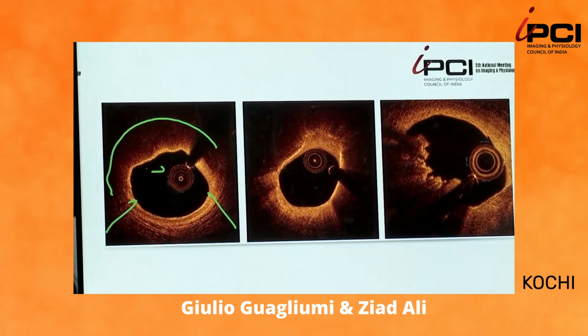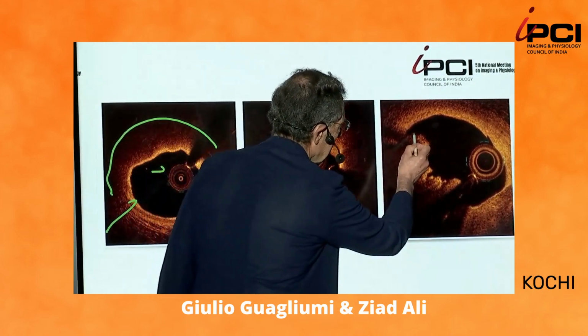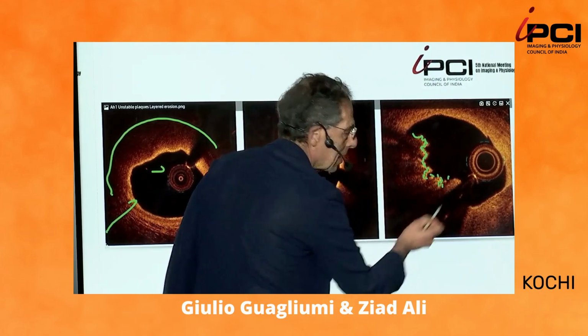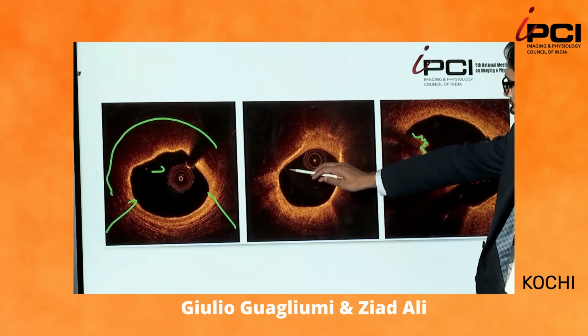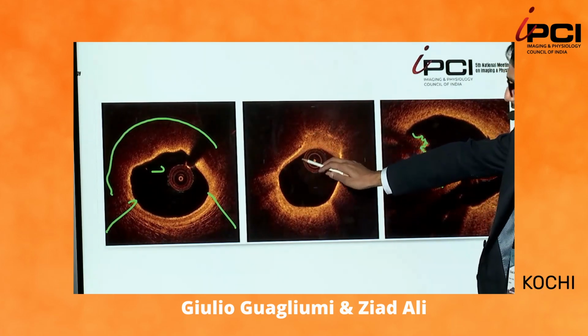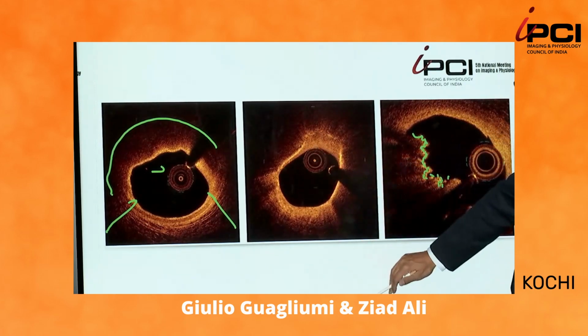Erosion, or nodule? No. This one is a nodule. This one is a calcified nodule in which you can see the irregularity of the lumen, like white calcium that was broken and became unstable. What about this one, Z? This signal attenuation suggests macrophages, and with an attenuation related to that, this may not even be lipidic plaque, but could be. So from this cross-section, I can't tell.